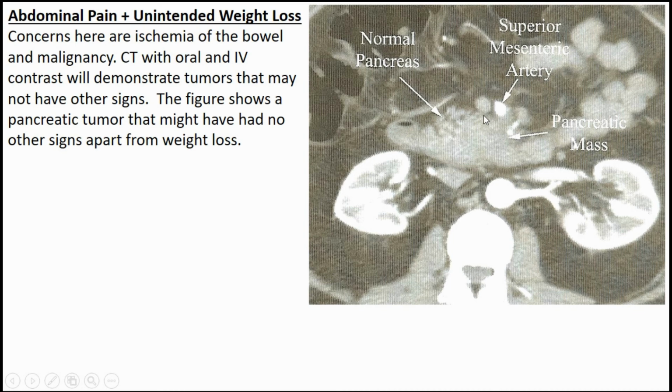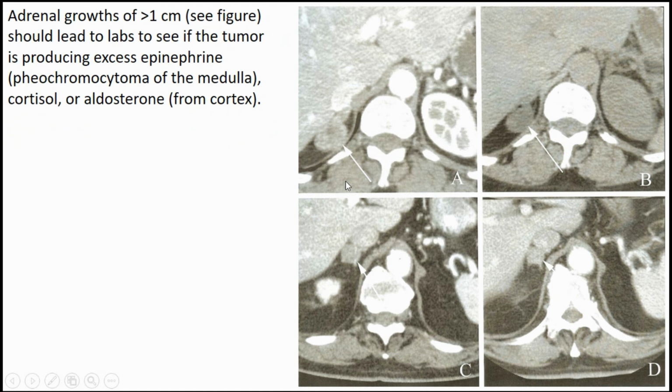Now, you guys are not radiologists. I would never expect you to identify that there's a mass here versus normal pancreas. I really just want you to get a sense of what you would order this imaging for and have that in your back pocket when you go into your clinicals. So right here, we can see that something interesting is going on.